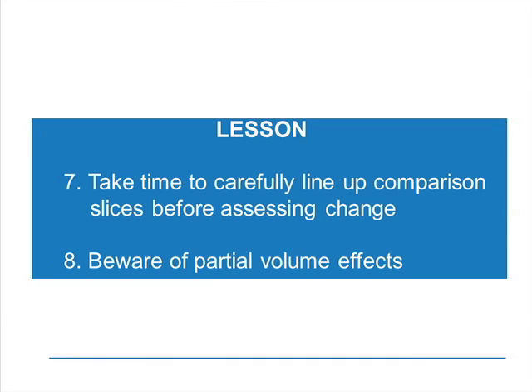So the lessons we've had now, number 7, take the time to carefully line up comparison slices before assessing any change. And number 8, beware of any partial volume effects.